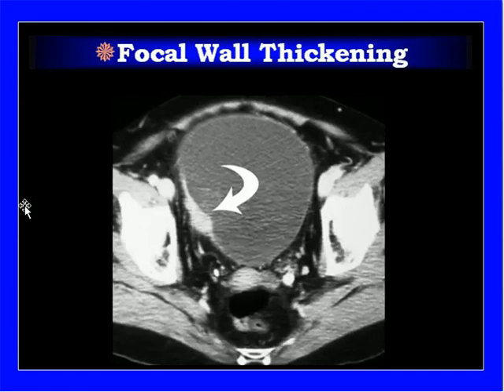This is focal wall thickening. Again, it's very difficult to differentiate it from bladder carcinoma, but cystoscopy, history, and lab investigation can tell us about the malignancy or the chronic wall thickening due to the focal cystitis or some other likewise conditions.